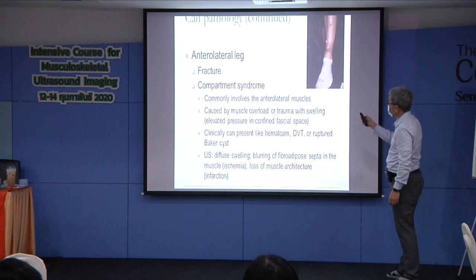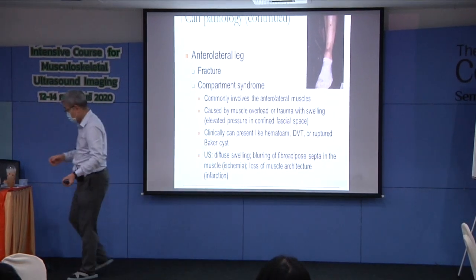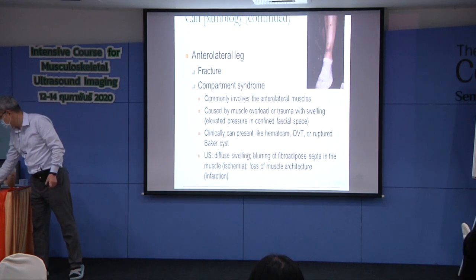And there is a lot of swelling in here. You would like to check whether or not there is a bone contusion.